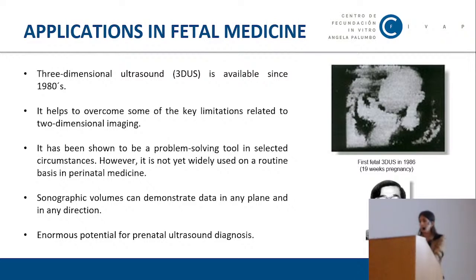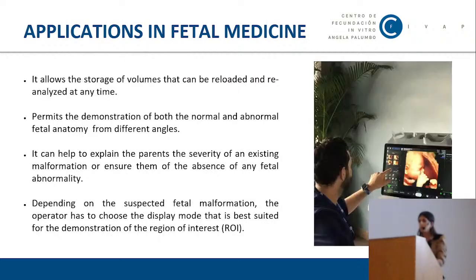However, it's not yet widely used on a routine basis in prenatal medicine, and the role of 3D ultrasound is still being evaluated in many areas. We can store not only images but also volumes that can be reloaded and reanalyzed at any time. And the availability of several display modes allows the demonstration of both the normal and abnormal fetal anatomy.